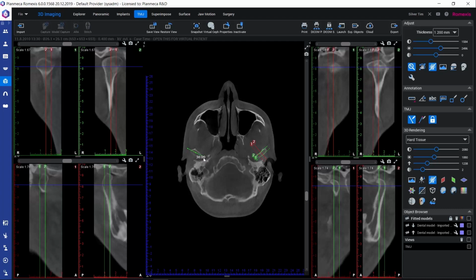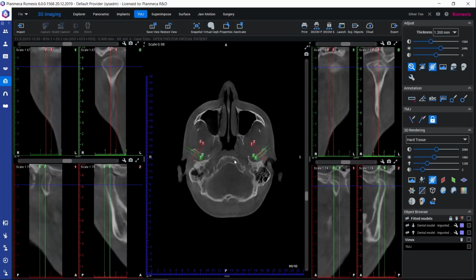And with the mouse, we could also determine the actual orientation. And then we could repeat defining the lines also on the left side. So for that, we would activate this left side posterior anterior line, and then we would bring our mouse here and remember to drag a little bit downwards so that we get the right orientation for the line, and we can still adjust the orientation with the mouse.